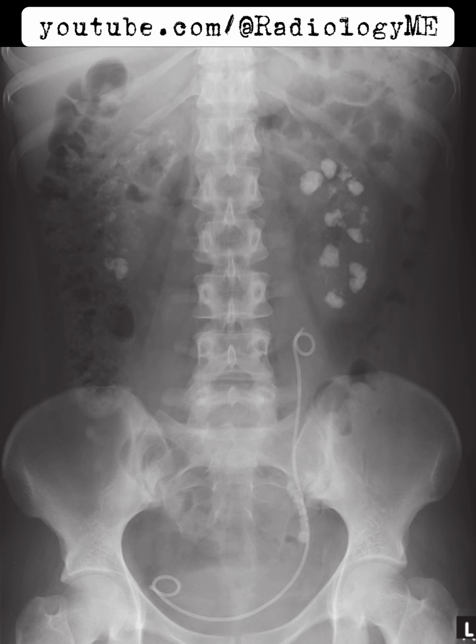The kidneys themselves look to be of normal size, and while the outlines are a bit obscured by bowel gas, I'm not seeing anything that would suggest something more sinister like a mass or obstruction. That said, this calcification pattern strongly suggests medullary sponge kidney, MSK. In this condition, the renal collecting ducts are dilated, which predisposes patients to develop kidney stones.